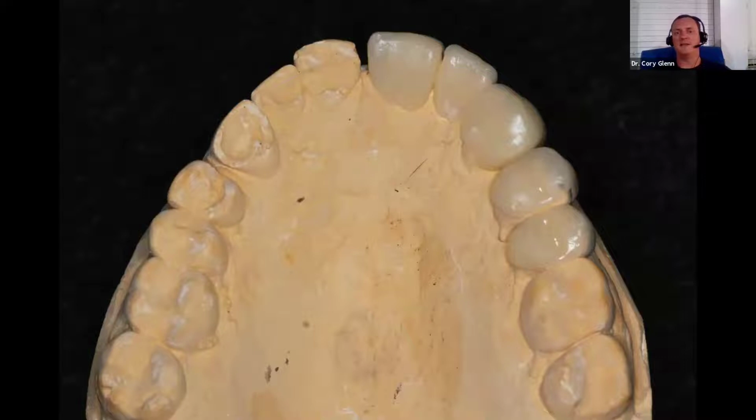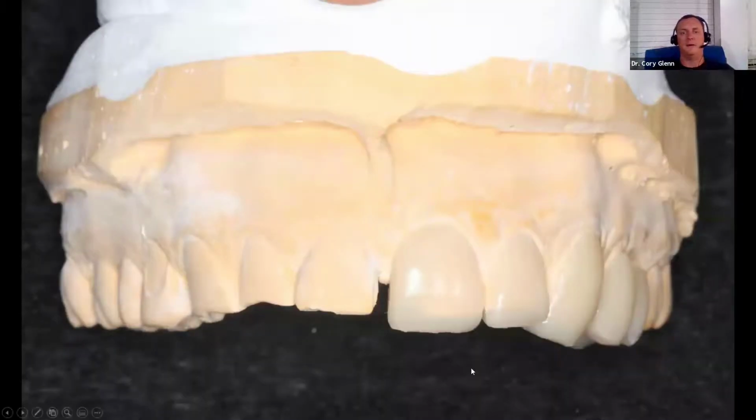And you could have a single appointment full mouth rehab. Okay, so you can see this is all additive, and we accomplish a full mouth rehab in a single appointment. And maybe this is not how you want to do a full mouth rehab. It'd be a great option for a budget case, a charity case, something like that.